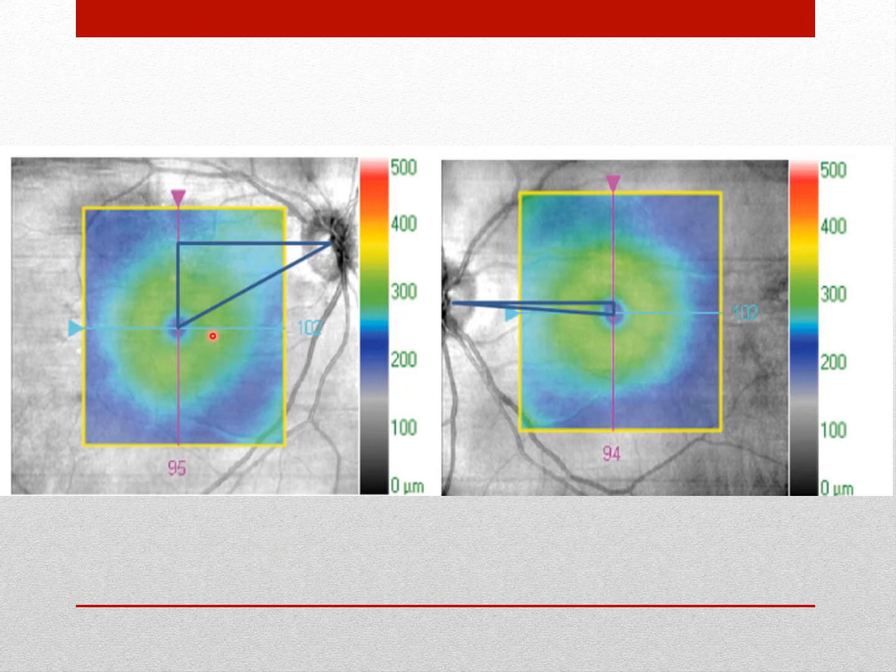To have this in the proper alignment, the eye will have to rotate inward, right, to that direction, more nasally, towards where the optic nerve here is, so that it can straighten it out. So for it to go inward, that means it was already out. So this is actually an excyclotorsion of the right eye. Looking here in the left eye, you see this is the proper alignment. It's not going to be a completely straight line, never is. There's always some degree of rotation there. This is normal though in the left eye.